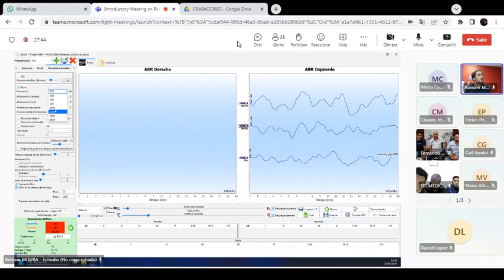Yeah, but if you see my screen, you have the selection of the frequency you can set. It's 1,500 up to 8,000 hertz. It's not 800, it's 8,000. Okay, perfect. Yes, we noticed that. Thank you very much.